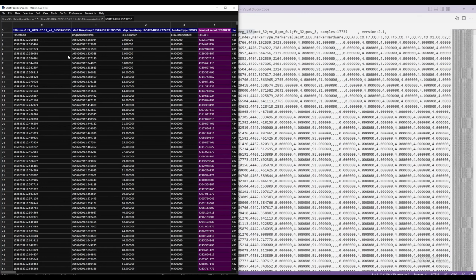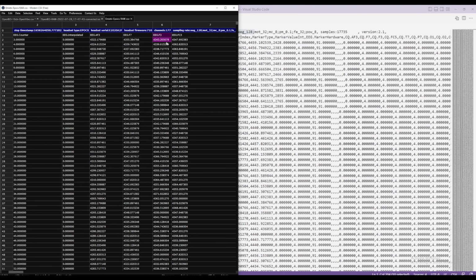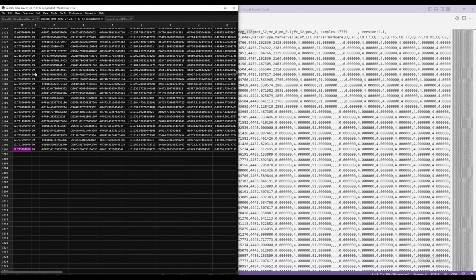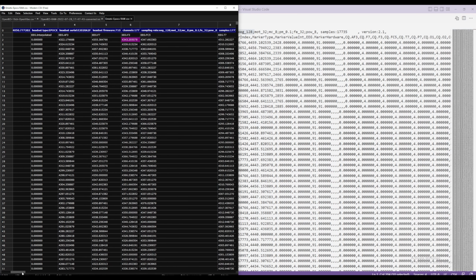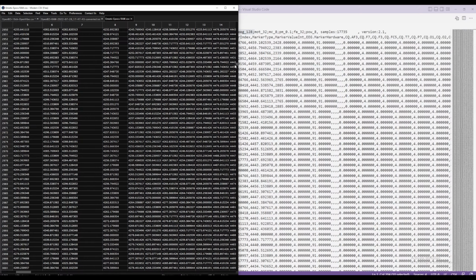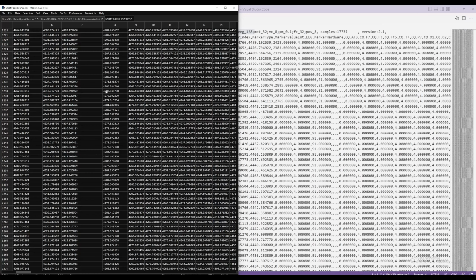But I can go ahead and just pick any 8 of these channels. And let's see how many samples we have. 3,200. So let's say 7... 1, 2, 3, 4, 5, 6, 7, 8. And we can just pick the samples directly and go down to 3,200. Just about.